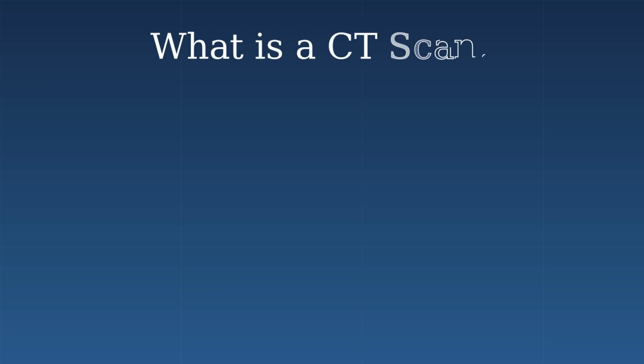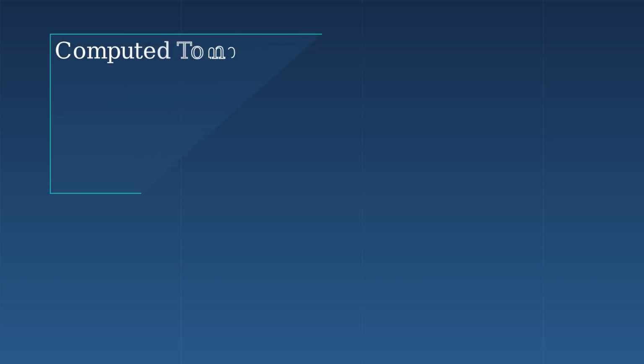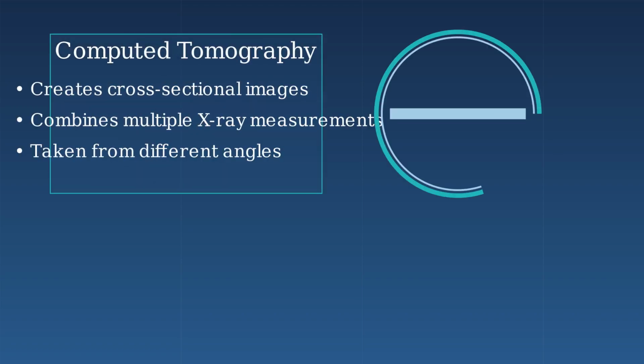What is a CT scan? CT stands for Computed Tomography, an advanced medical imaging technique that provides doctors with detailed views inside the human body. CT scanning combines multiple X-ray measurements taken from different angles around the body to create cross-sectional images.